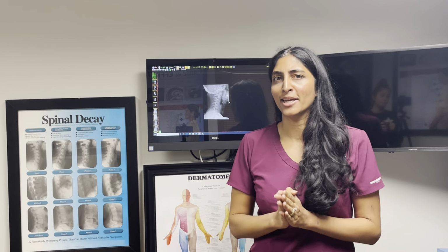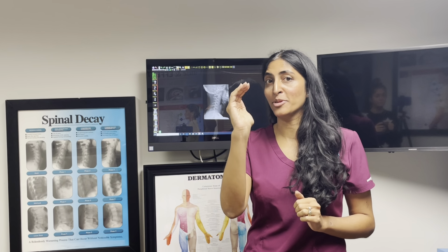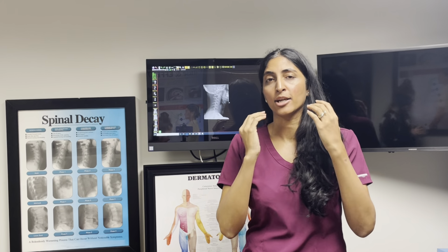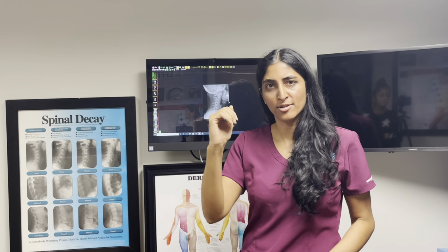The side view of the neck is so important, especially if you're in a chiropractic office, because the curve of that neck is going to determine the biomechanics of the entire head. The head is a bowling ball that basically sits on your neck. So if that head is too far forward, guess what? It puts undue pressure on the neck. Sometimes even having a bad neck curve can actually give you lower back pain, because here's what happens.